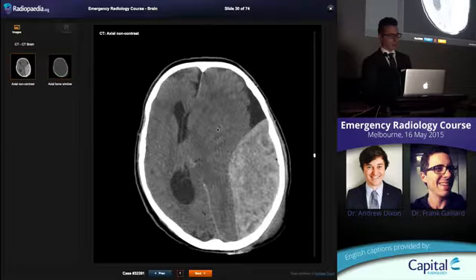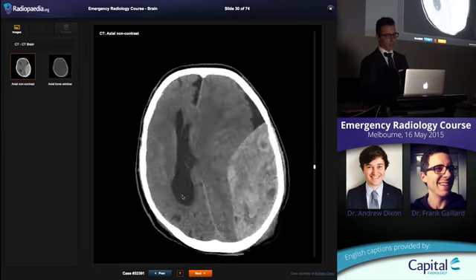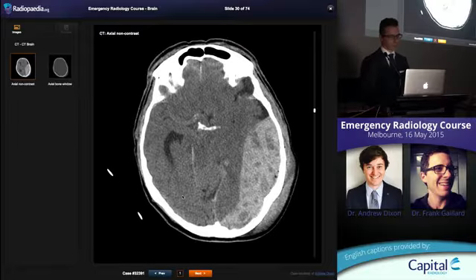You won't be surprised to know that this patient's probably not doing very well by now. The amount of midline shift is dramatic, and it's made worse by the fact that this ventricle now can't empty, so it's still producing CSF, and it's adding to the pressure effect. So they need emergency decompression, and we hear about brave GPs doing it clinically up in the bush because you don't have time to transfer these people down.